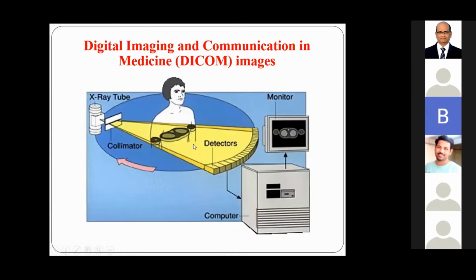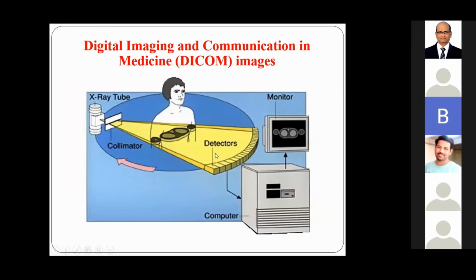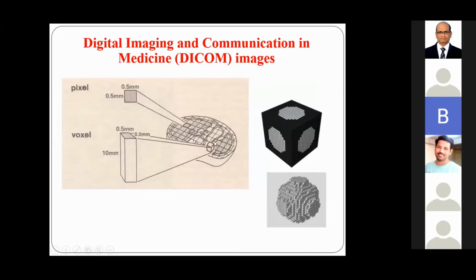When we are developing these DICOM images, first it is taking the total information. That is called the field of view. How much length, how much volume you are going to extract, based on your gantry rotation, that decides the field of view. That is the FOV. Wherever the tissues are there, only there is the density assigned, and the remaining it is taking as null. Here is positive, here is null. Like that, we are capturing the data using various back projection algorithms, various imaging algorithms.